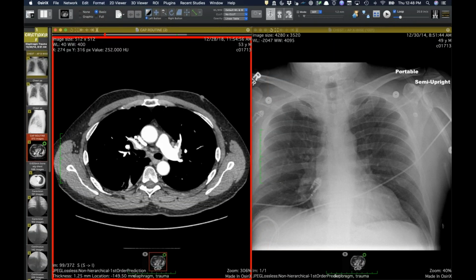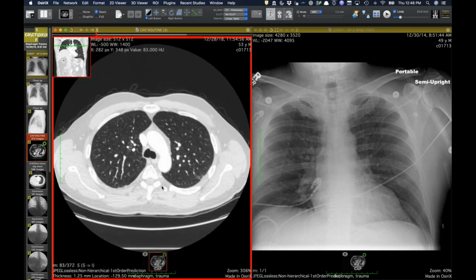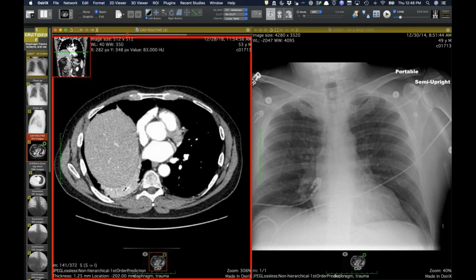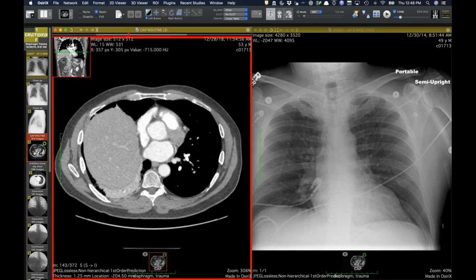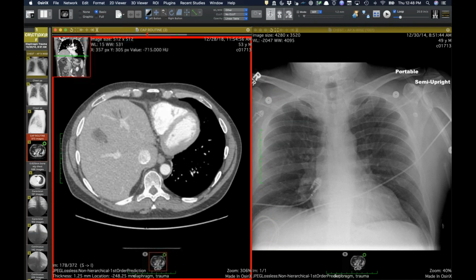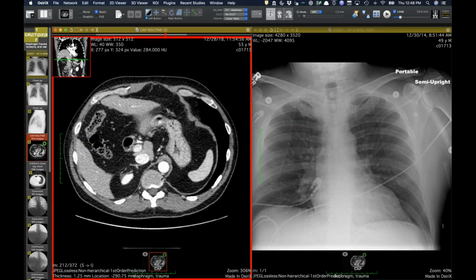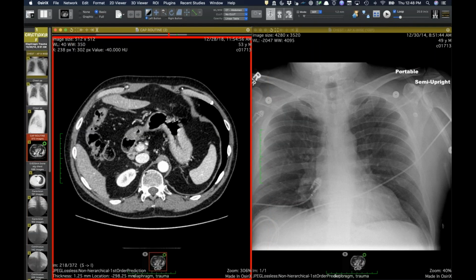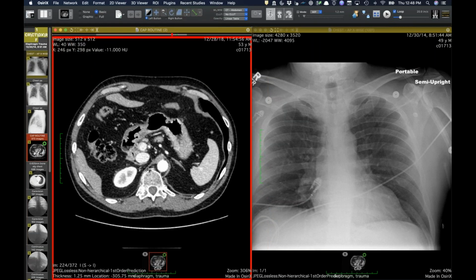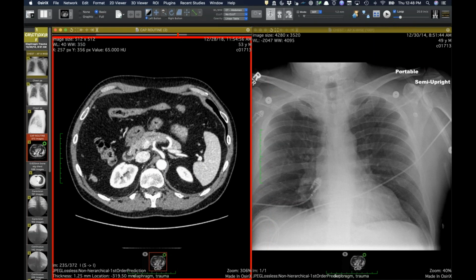I don't know exactly, they were looking for just whatever cause of shortness of breath. He ended up undergoing a million-dollar cardiac workup after this too, which was all negative because they couldn't figure out why he was so short of breath. And I know I had emailed Howard and David a couple months ago in regards to a different case. I think this is a nice example of showing thinning of the diaphragmatic crus on the right.